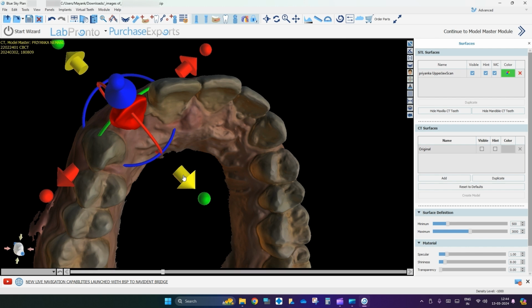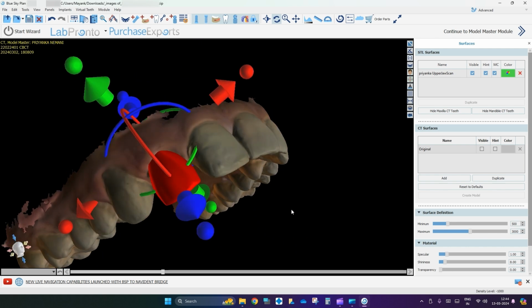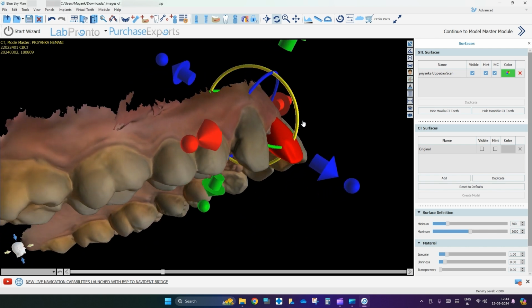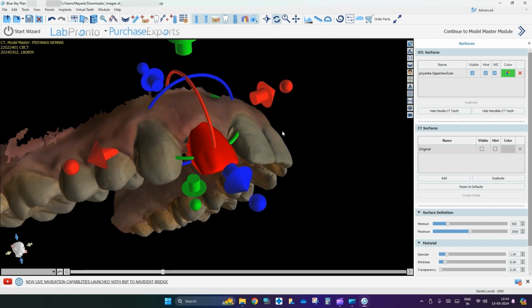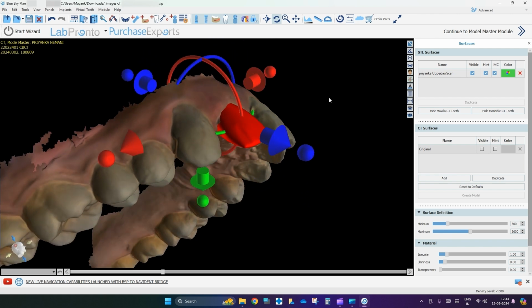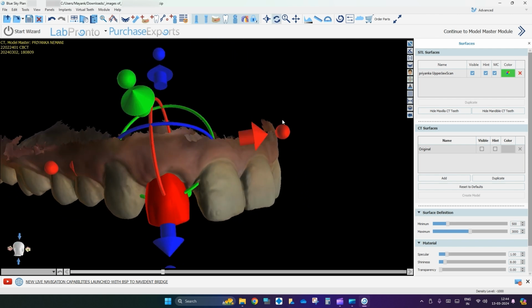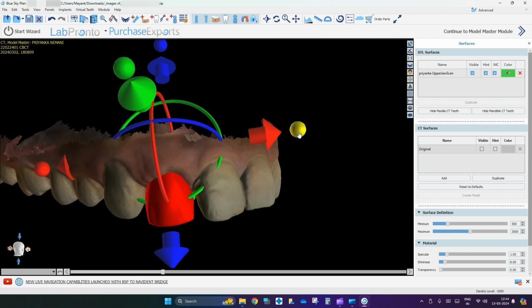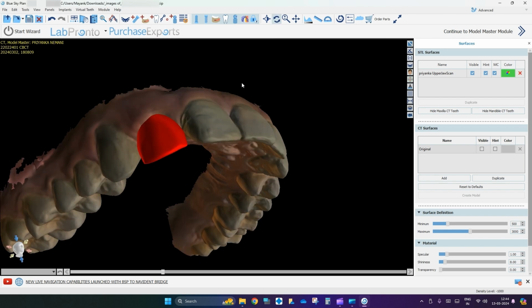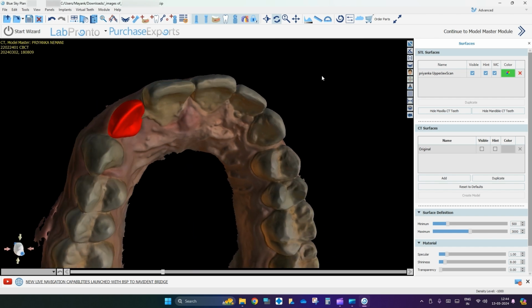At this point, if you wish, you can even get the patient's lower in occlusion to check how well adjusted it is in the patient's occlusion also. We'll take that up as soon as we are done aligning this tooth. So, let's extend it a little so that it embeds into the design better. Let's rotate it a little bit, slightly wider. Okay, done. So this looks okay.